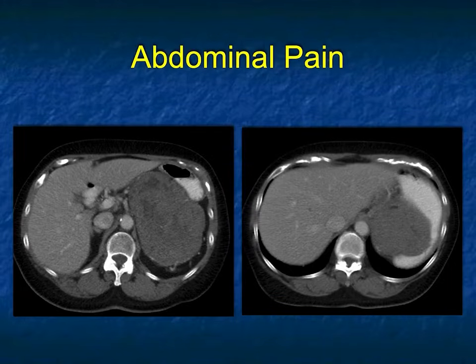This patient has abdominal pain and there's a large solid mass in the left upper quadrant. Now, one of the challenges only seeing these images is that I could be dealing with a large adrenal tumor, like an adrenal carcinoma. I could be dealing, though not the greatest likelihood, of a large mass in the tail of the pancreas, like a SPEN tumor, or maybe a neuroendocrine tumor.